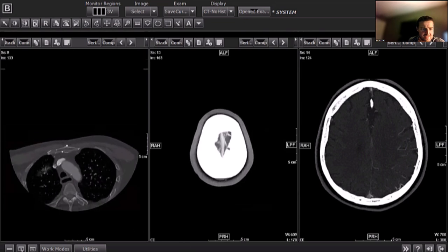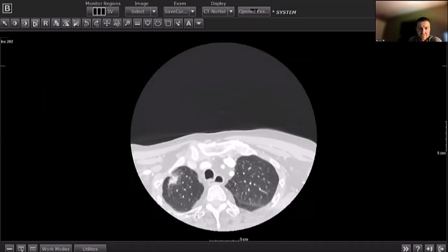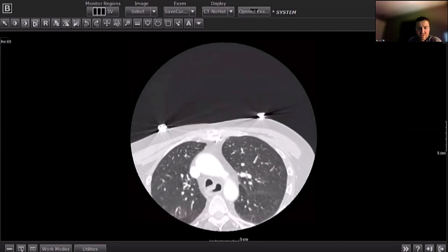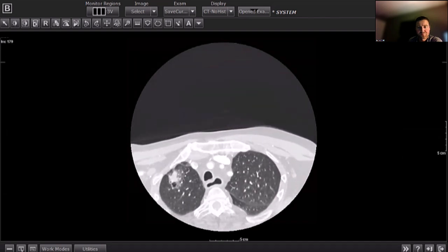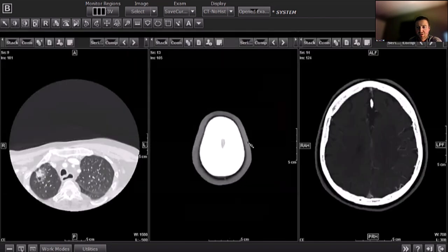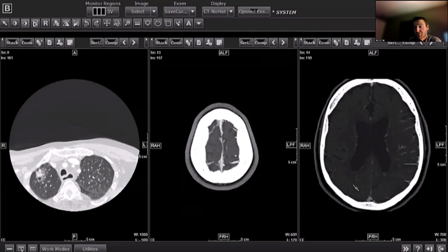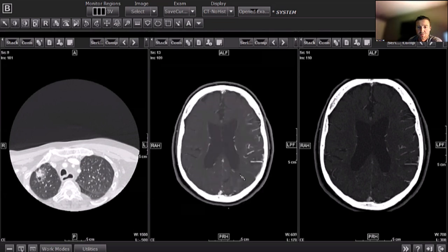That can be fairly helpful in the upper chest as well. So this patient had undiagnosed adenocarcinoma of the lung. If you see that, just make sure you do a really, really close interrogation, even of the source images of the delayed, just to see if there are any enhancing lesions that may be occult, because they may predispose them to hemorrhage as well.